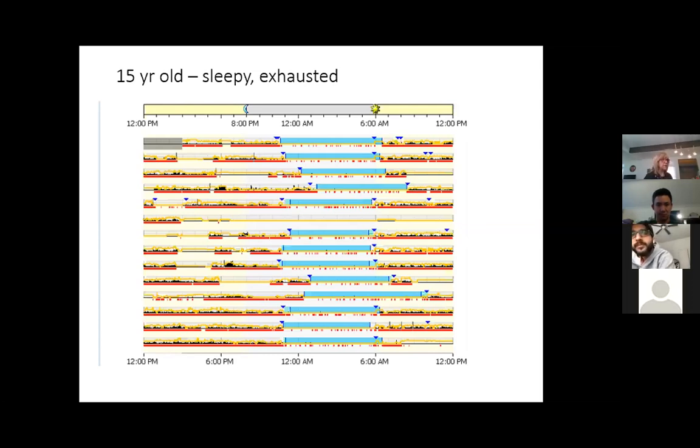Look at that. Then I also asked him to push the button when he had some irresistible sleepiness. Here's a nap. You see that? And he actually told me he took a nap. This was a great patient. Most of my patients are not so reliable.